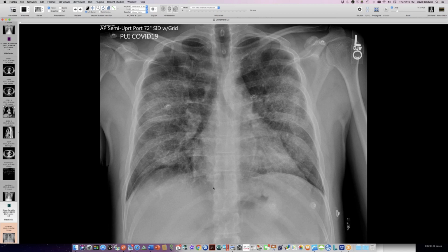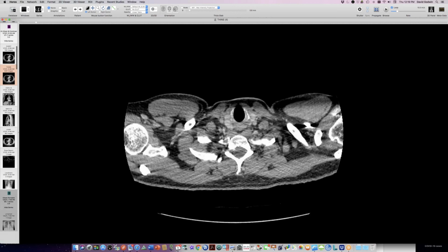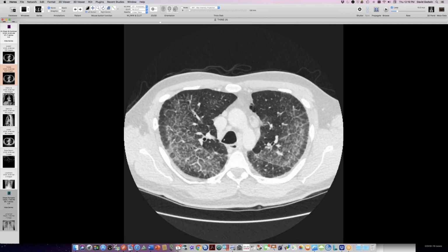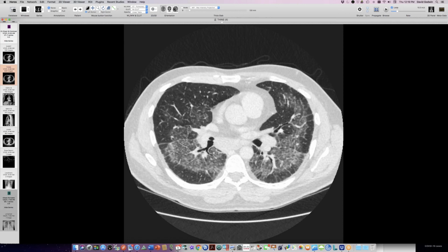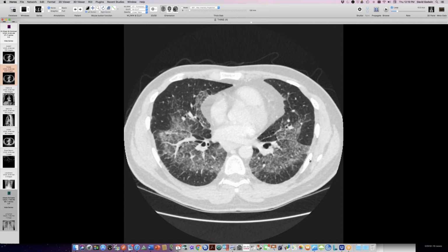And he got a little short of breath, and then he developed this sort of chest radiograph, and he had some imaging around this time. Let me show you these thin sections. He has a lot of lung disease. It's ground glass with lots of septal lines, tons of septal lines, and this bright border posteriorly, sort of isolating this, so it seems to be floating away from the edges of the lung, but there are lots of septal lines down here too.